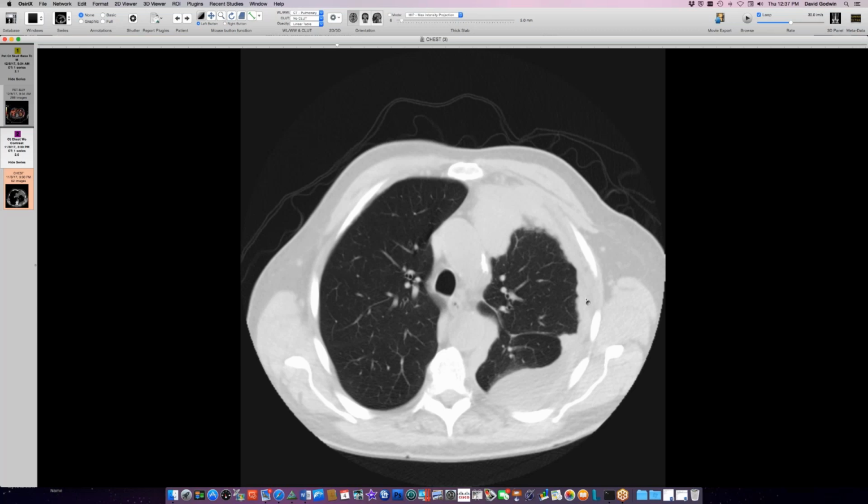So the immune stains show positive staining of tumor cells for pankeratin, CAM5.2, vimentin, CD99, along with patchy strong staining of TTF1, which doesn't go with meso at all. Weak focal nonspecific staining for calretinin, but no staining for a bunch of others, including mesothelin and desmin, or CD30. This immune phenotype offers no support for mesothelial differentiation despite the diffuse growth pattern.